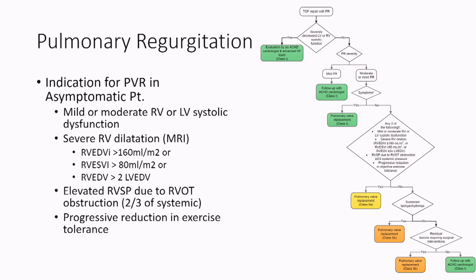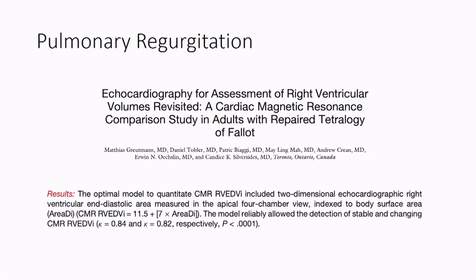Hopefully it will work. And you can see here that this is not working. You cannot really assess it that well, but you can see that there's a lot of aliasing in the diastole. Again, the report was like this: need urgent fluoroscopy or CT to rule out a stuck valve or something.